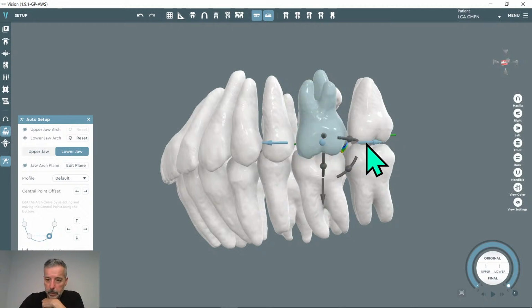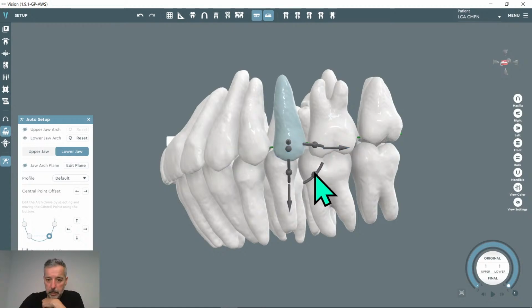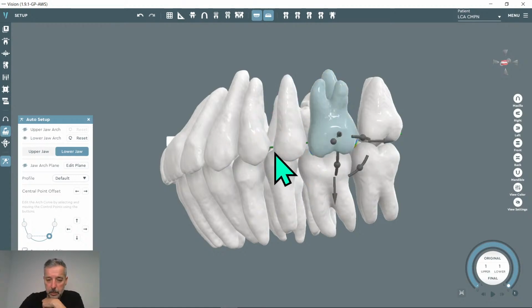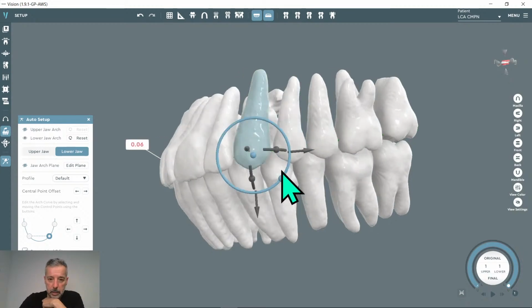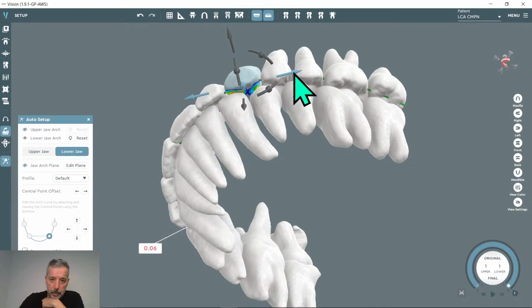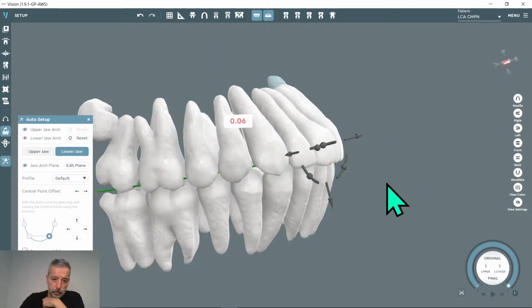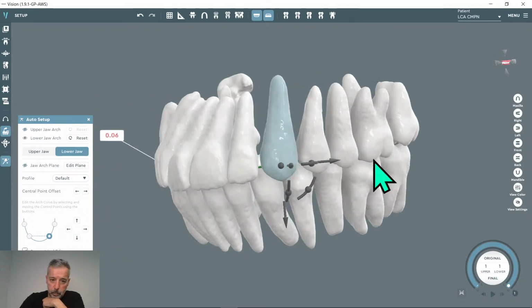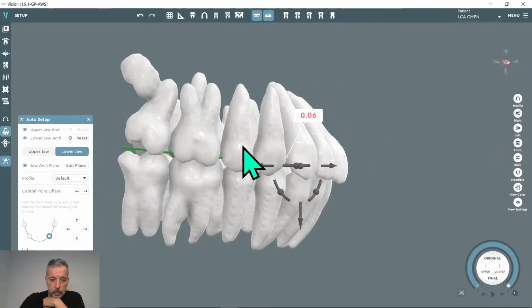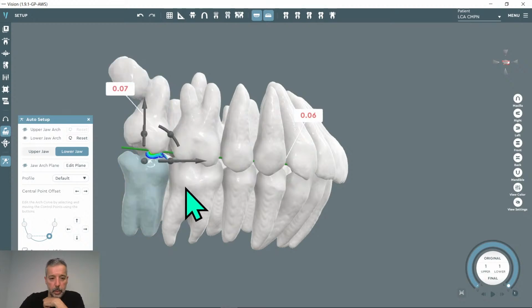And move the second molar like in class 1, and also this one, and change inclination, and also this one, just change inclination and put like this, canine, just do this one. Okay. And also this one, or maybe this one.